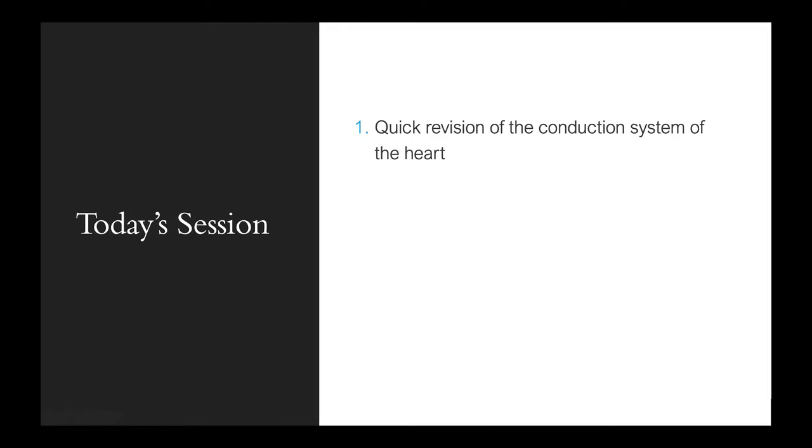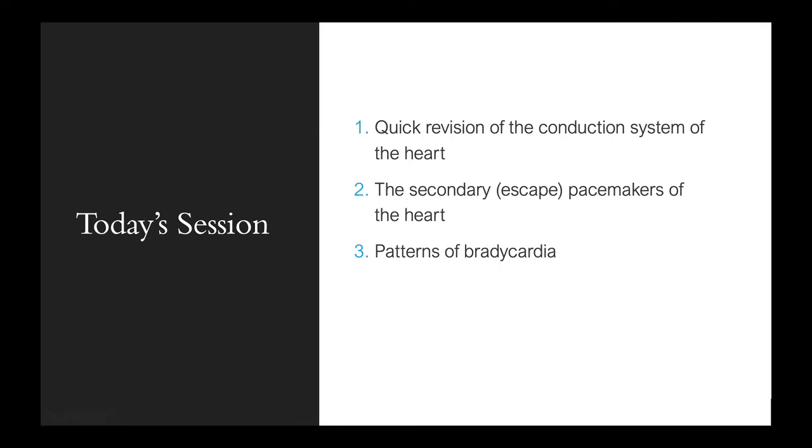So in today's session, we're going to have a quick revision of the conduction system of the heart. We're going to look into the concept of the secondary or the escape pacemakers of the heart. We'll look at the different patterns of bradycardia, and once we have done that, we'll have an approach to ECG with bradycardia, and then we'll end by looking at two test ECGs.